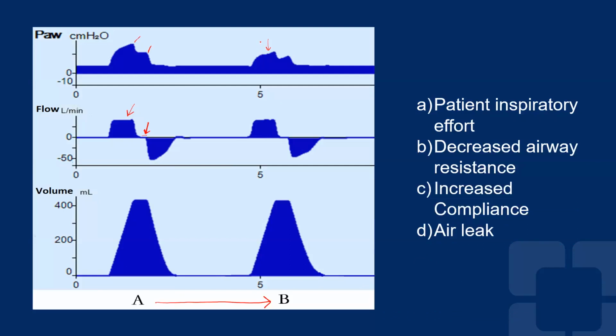And then there are other modes, we're not gonna go into it, in which they can change from volume control to pressure control, and that's what you see here on pressure control. So the point is, this is all work shifting. It manifests differently on each one of them. Some of them you need to do something, some of them you don't. Technically, and this is a common thing, in this patient that has work shifting, even though you see this drop in pressure, the patient is still getting pressure from the ventilator. So the ventilator is still doing work on the patient.